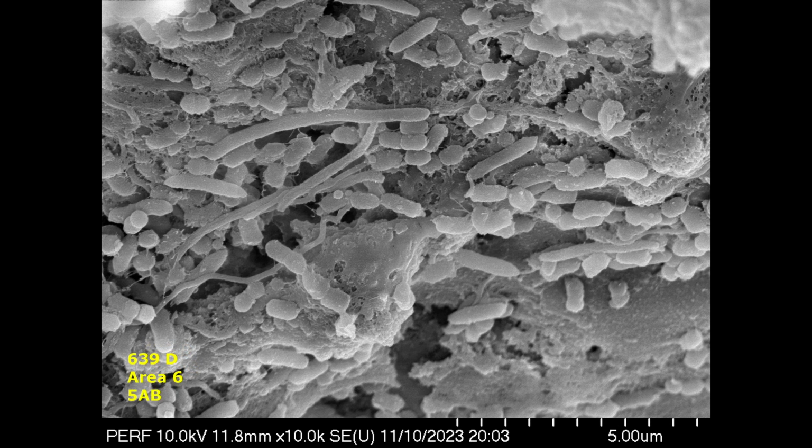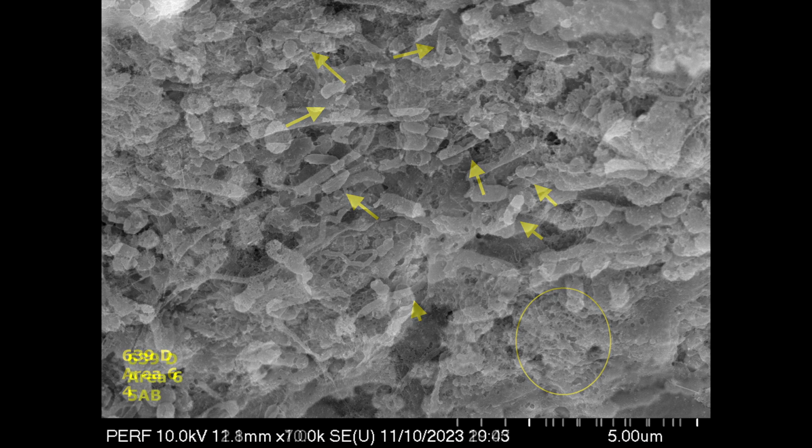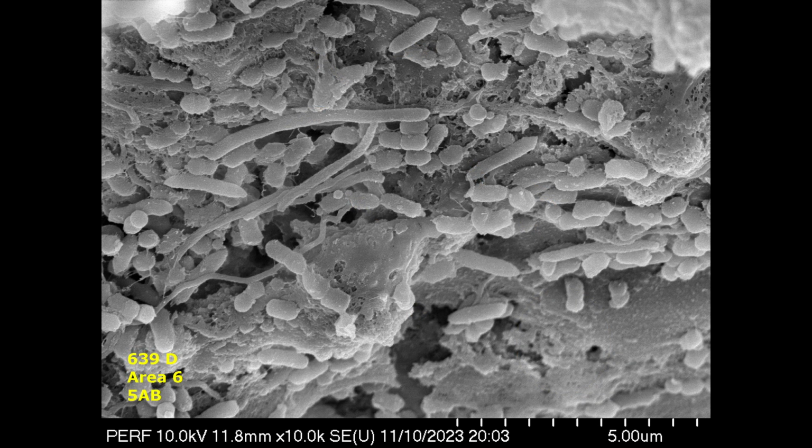So all in all, a very interesting case. It's kind of an ideal type of case where you can actually see what the device can do when there's very little instrumentation. And it did a pretty good job of removing the predentin, I would say, but not a good job of removing the microorganisms.